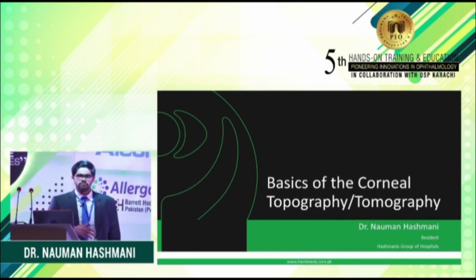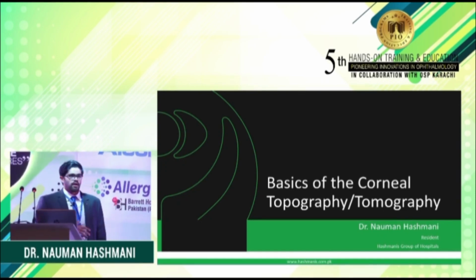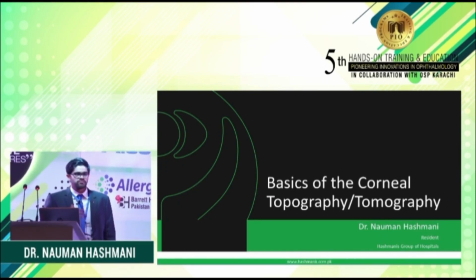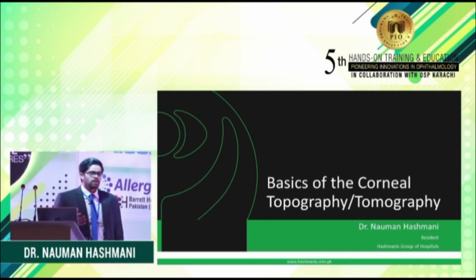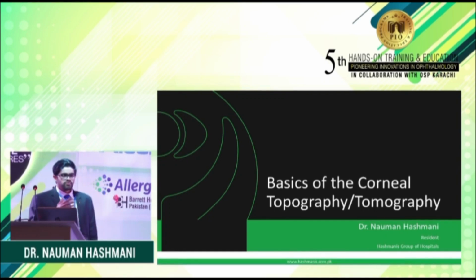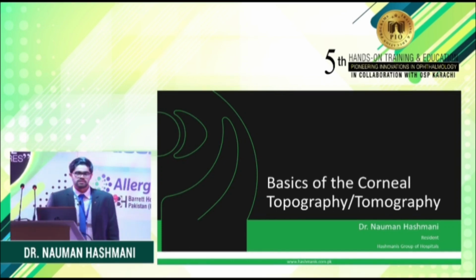A lot of people have focused on the difference between the superior and inferior curvature maps, looking at the thinnest point of the elevation maps, and that's all fine, but you miss a great number of people if you're not doing a proper qualitative assessment of the topography, and that's the main point of today's lecture.